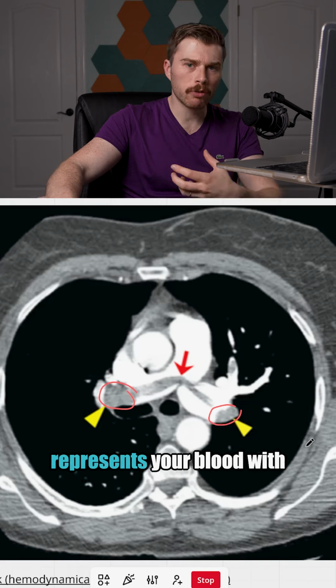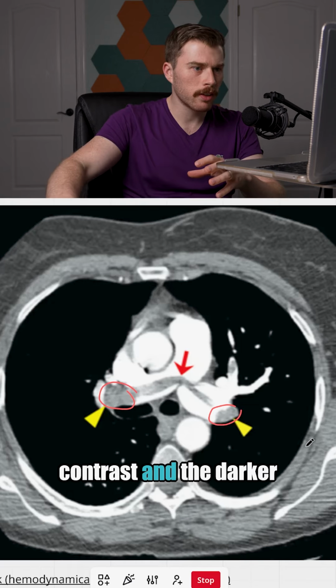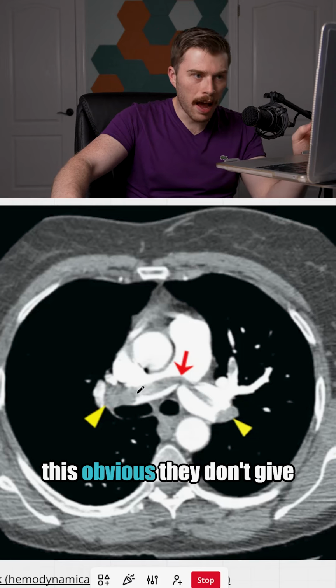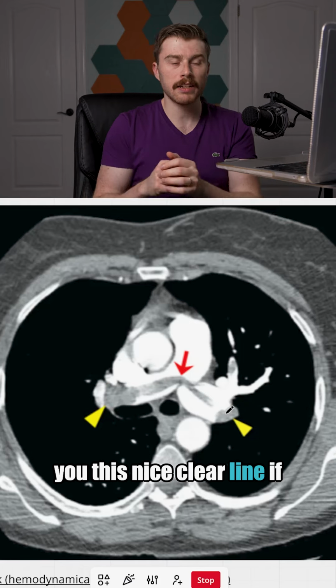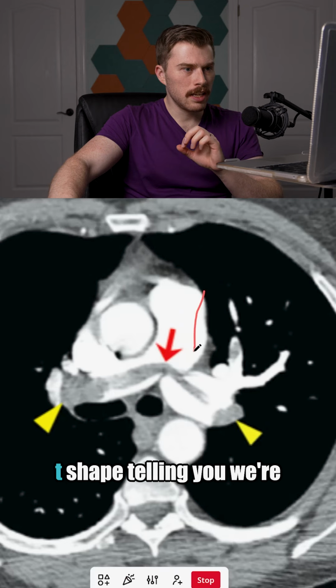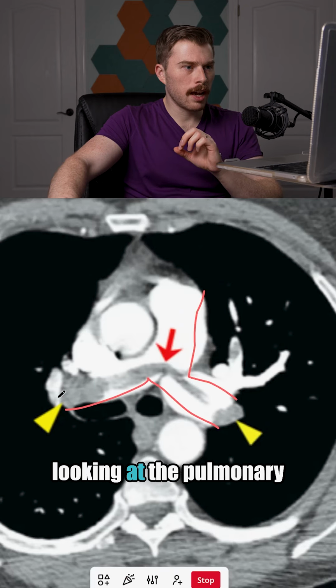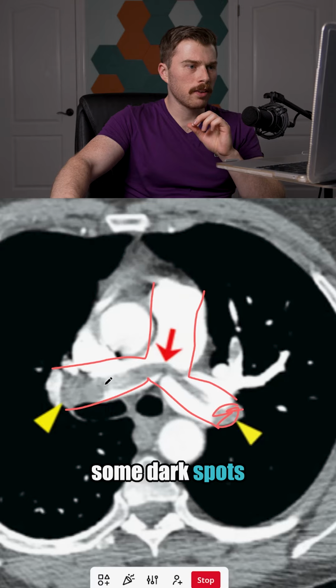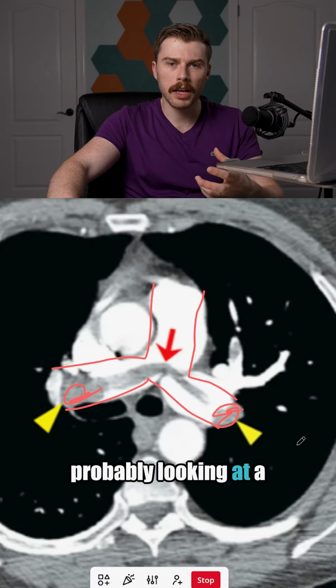The bright white represents your blood with contrast, and the darker spots mean there is no blood. Sometimes it's not this obvious. They don't give you this nice, clear line. If they do, obvious pulmonary embolism, but just look for this kind of T shape telling you we're looking at the pulmonary trunk and pulmonary arteries, and then look for some dark spots. If you see those, you're probably looking at a pulmonary embolus.